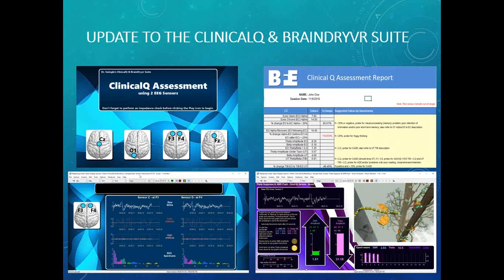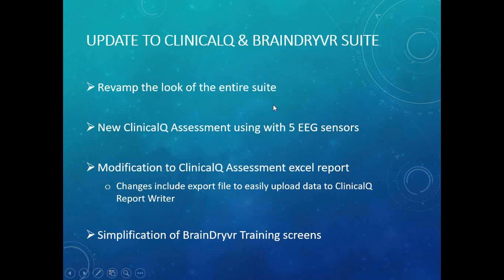The reason that I'm waiting 2 weeks is because I'm still having 1 or 2 beta testers get me back their feedback, and it's always fun running after people when you want them to give you some information. Here's just a few key points of what has changed in the software, but I'm going to jump in and we're going to look at the software together to make it more concrete and better understand.